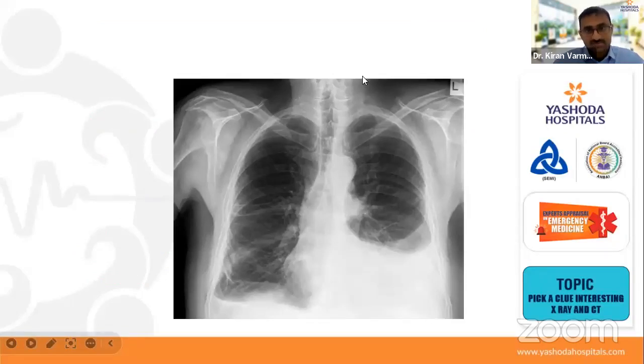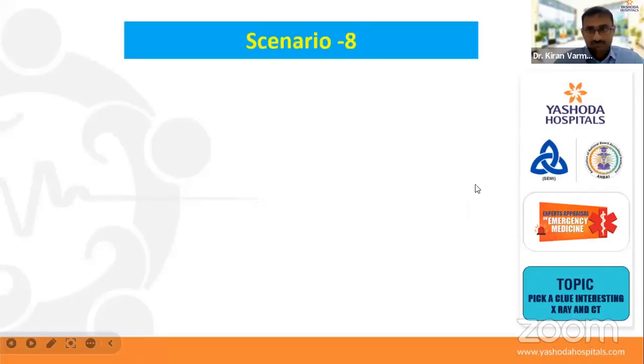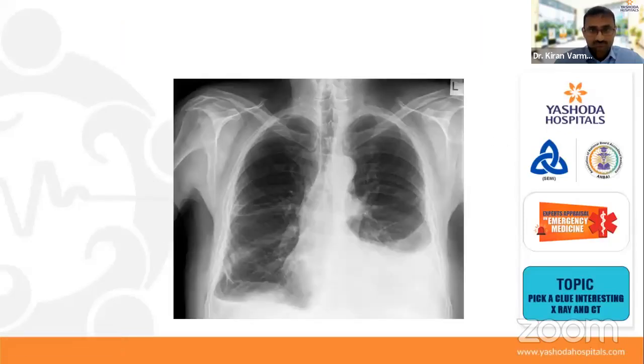Effusion. This is the X-ray. So what do you think? So what is your diagnosis? History and X-ray, both are fine.